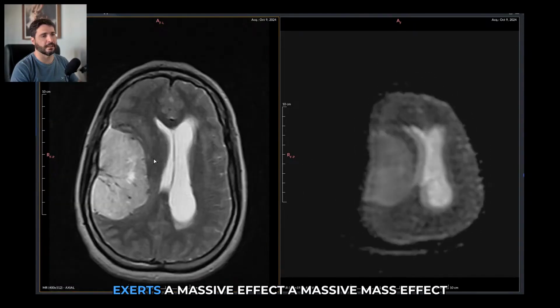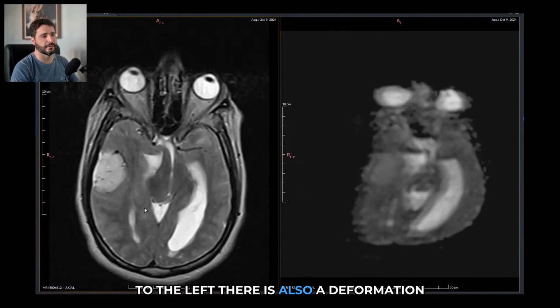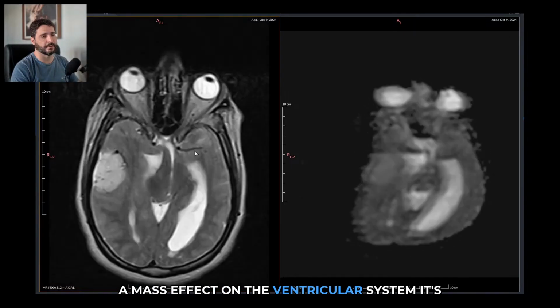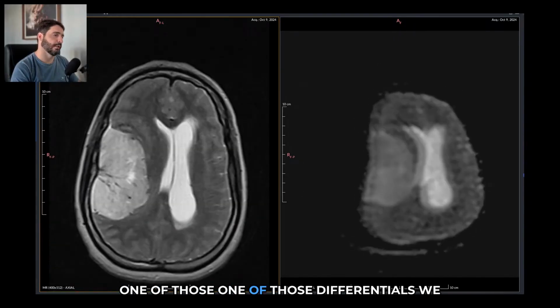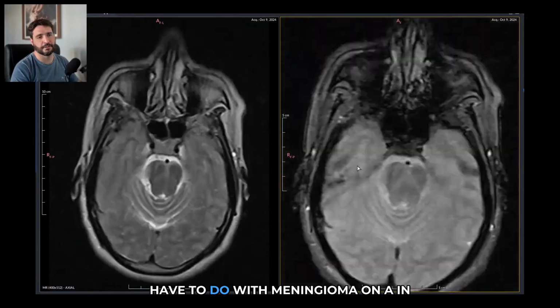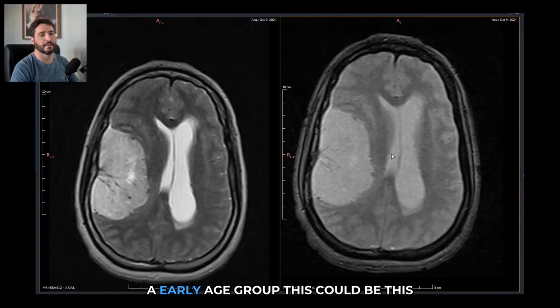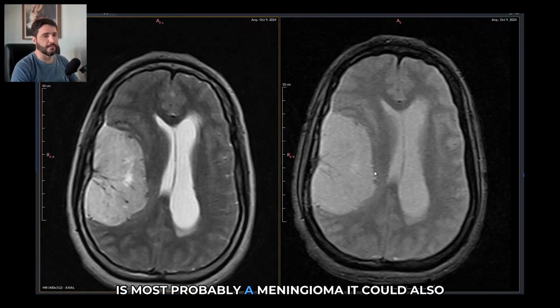It exerts a massive effect, a massive mass effect over the parenchyma. There is a midline shift to the left. There is also a deformation, a mass effect on the ventricular system. It's one of those differentials we have to do with meningioma in an early age group. This is most probably a meningioma.